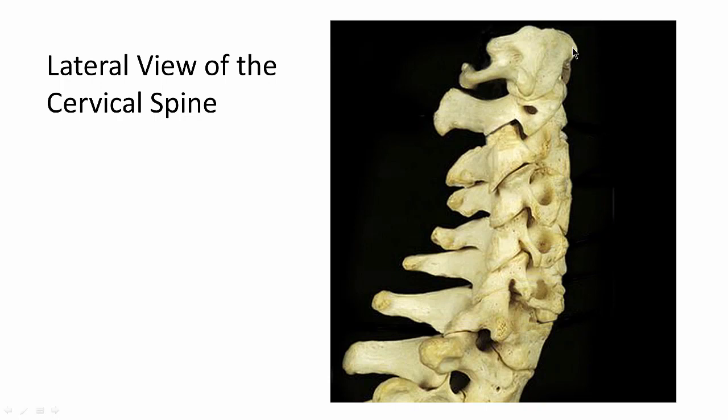There's an anterior arch as well with an anterior process, which isn't very prominent looking here. Remember, the dens would go up inside of here to connect to the anterior arch of atlas. We can't see it on this view, but we will see it. You can also see the spinous process of C2, which is also called axis. It has an inferior articular facet here, where it articulates with C3's superior articular facet and process. Remember, the superior articular process contains that hyaline cartilage, that articular cartilage, which makes up the superior articular facet.